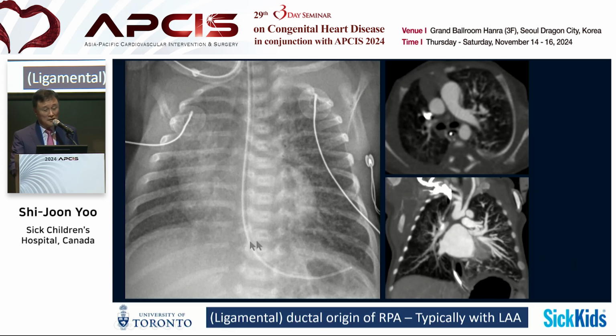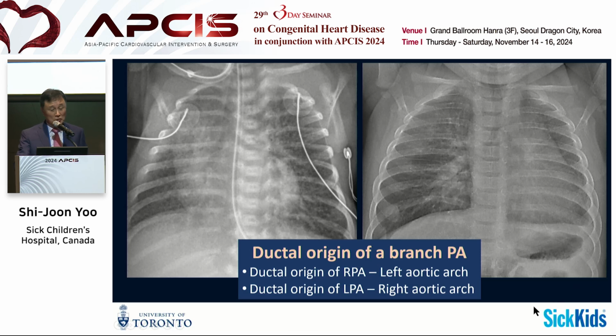So therefore, with plain film diagnosis, if you miss this one for a couple of months, you will not have that opportunity to make the right pulmonary artery grow better. Okay. So interesting is that ductal origin of a branch pulmonary artery, either right or left: ductal origin of the right pulmonary artery almost always occurs with the left aortic arch. Ductal origin of the left pulmonary artery almost always occurs with right aortic arch.